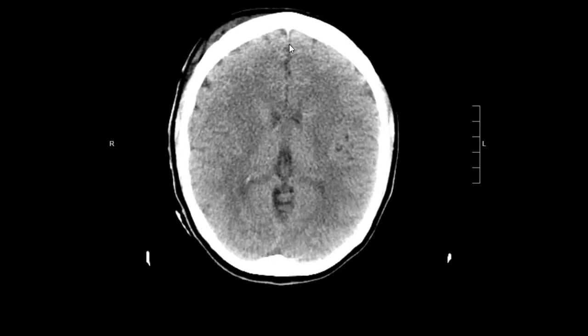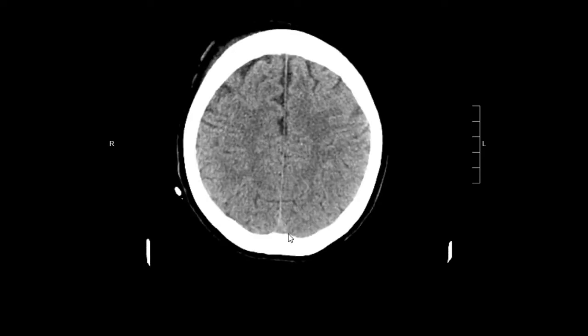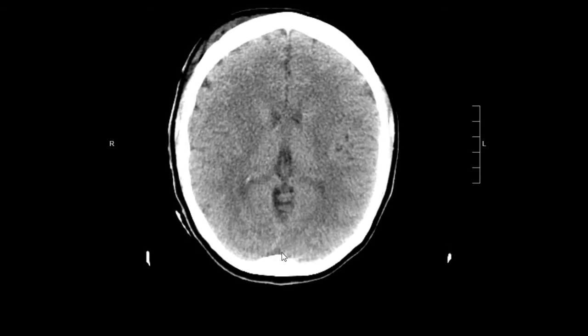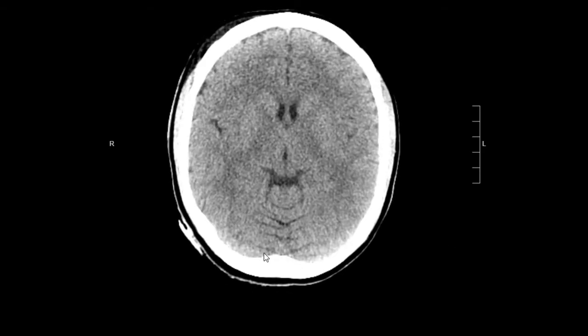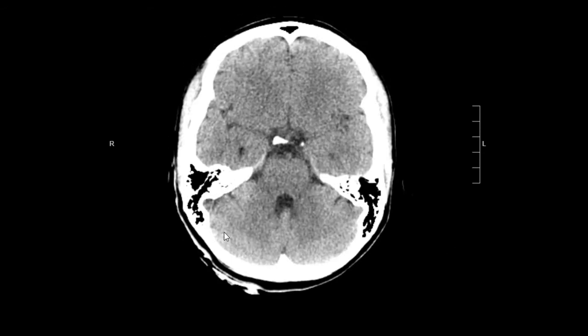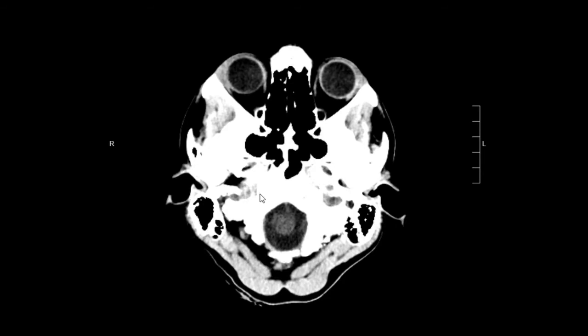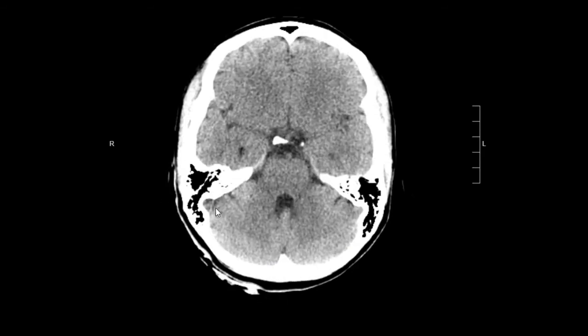We're going to look along the falx cerebri as well. This is another place that extraaxial collections can be. And at the same time, I'm also going to be evaluating the density of the larger dural venous sinuses. This is the superior sagittal sinus. We don't want to miss any kind of dural venous sinus thrombosis. So nothing along the falx. We're going to continue looking at the dural venous sinuses, along the transverse and the sigmoid dural venous sinuses, and there's no abnormal density to suggest any significant pathology. So far everything is negative.